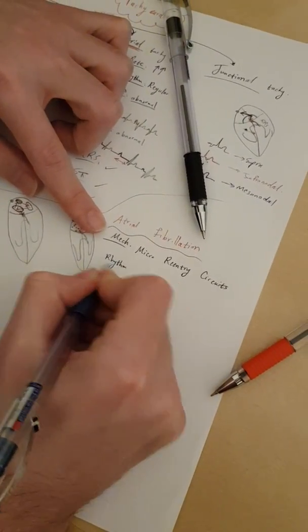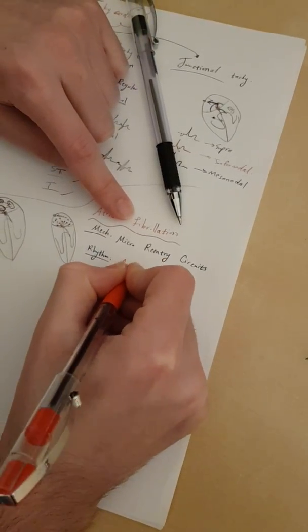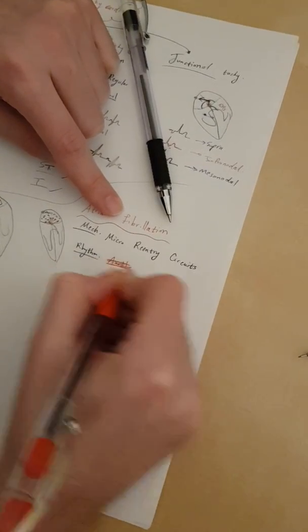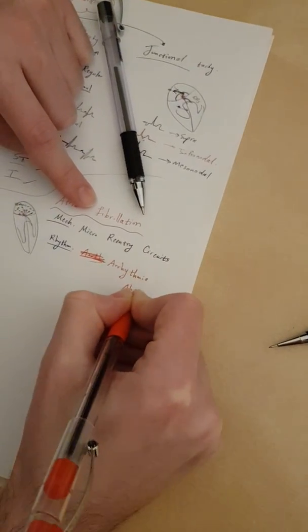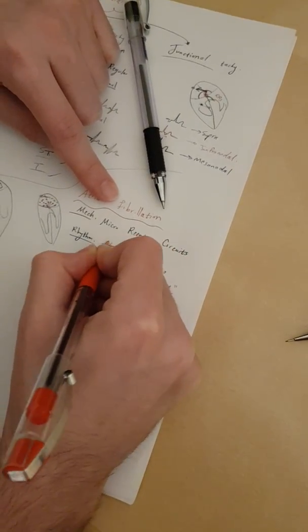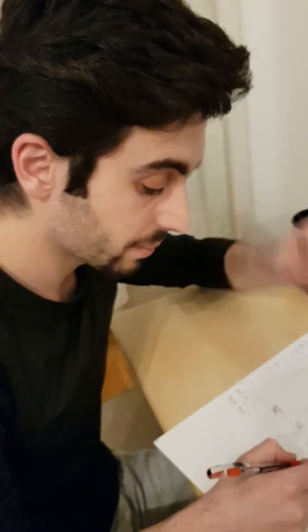And here's a key word that you really need to say in both exams. The rhythm in atrial fibrillation is called arrhythmia absoluta. I know it's absolute arrhythmia, but bear with me. Just say the Latin one, please. Examiners will like you better. So it's arrhythmia absoluta. But what does arrhythmia absoluta mean?